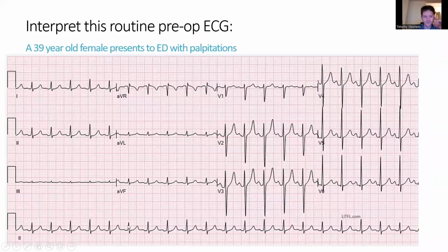Again, heart block's a whole other topic to consider. Your QRS here, as you said, is it narrow? Is it broad? And thereafter, you're looking at whether you've got any ST elevation or depression, and T wave morphology. Is it inverted?